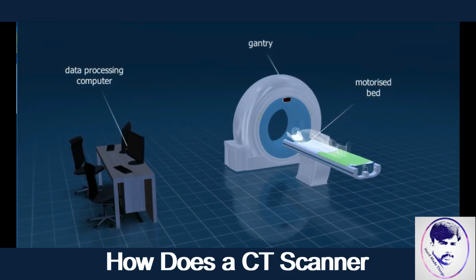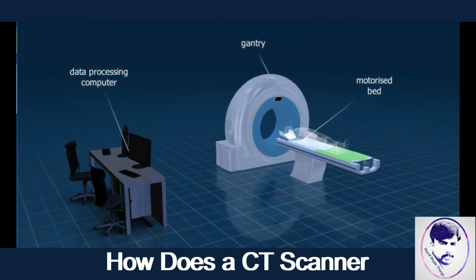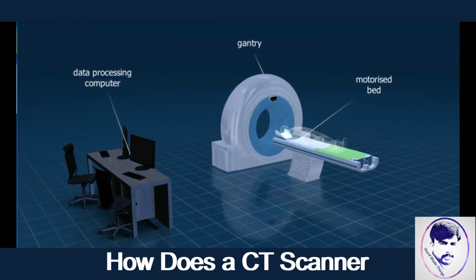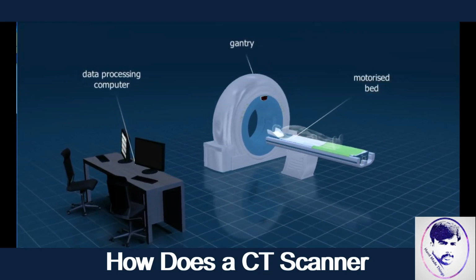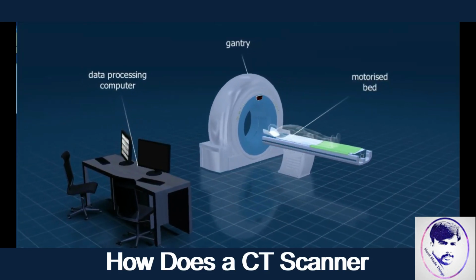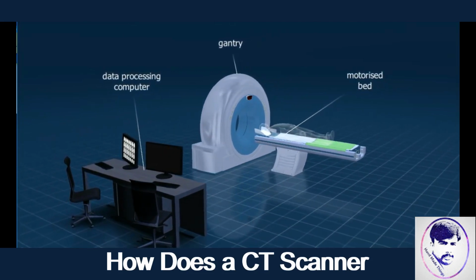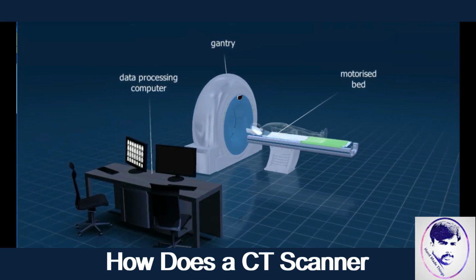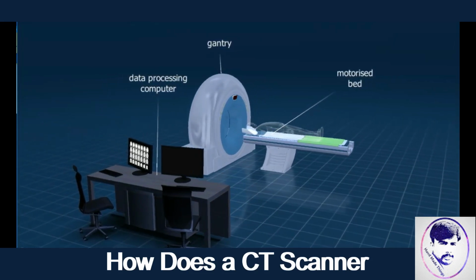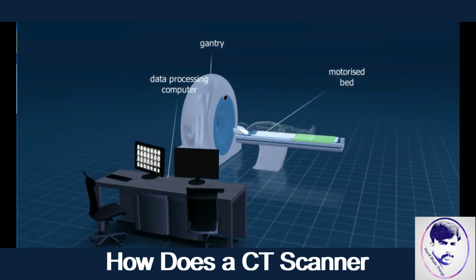Conventional X-ray images show the extent to which a beam of X-rays is absorbed while passing through tissues in the body. Tissues that absorb a large amount of radiation, such as bones, are well defined in X-ray images. Air-filled spaces are also easily identified because they do not absorb X-rays. X-ray images represent overlapping tissues in their totality, making it challenging to examine internal organs, soft tissues, and the brain.